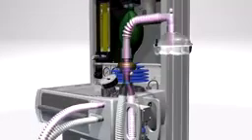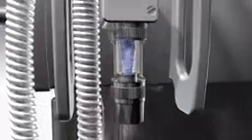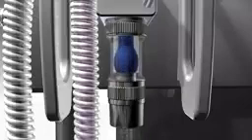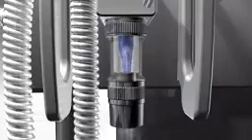The expiratory limb of the Y-piece channels gas to an inflating valve on the UAM that functions like an ambu valve. It uses a balloon made from long-lasting silicone, which closes during inspiration to direct gas into the lungs. During expiration, the balloon empties and opens the exit port, allowing exhaled breath to flow out through a final one-way valve to a scavenging device.